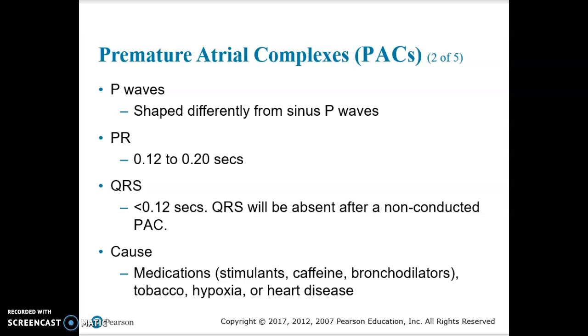If you see a pause and you're tempted to call it sinus arrest or sinus block, you need to make sure there's no P wave. And remember, that P wave can be hiding in the T wave. So make sure that it's not a non-conducted PAC. If you're confused and don't know whether it could be a sinus block or sinus arrest, you look for that P wave.